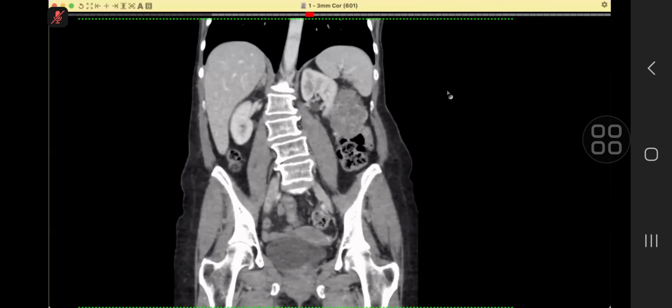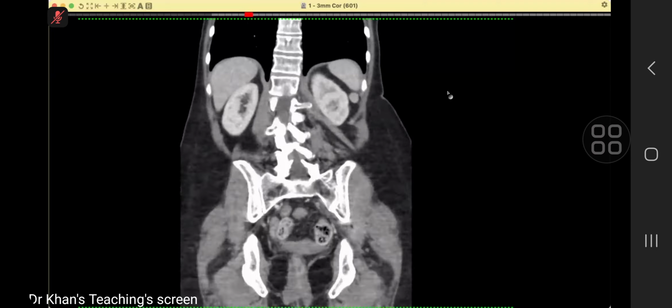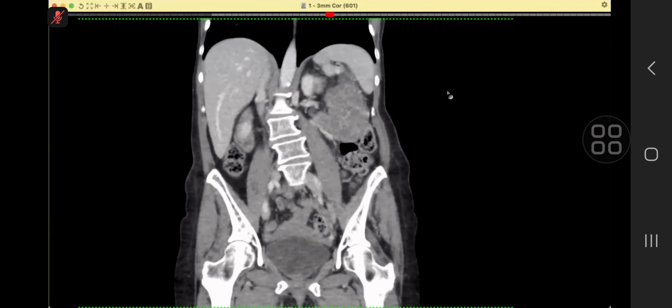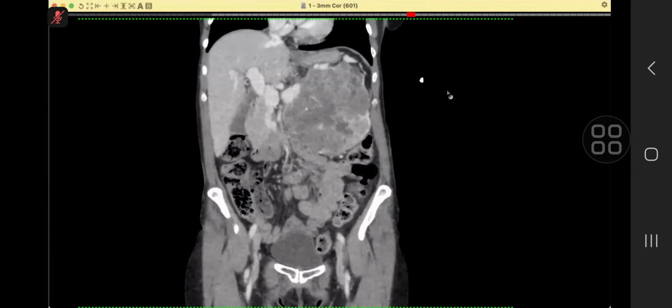What about the adrenals? It is not from the adrenal, not from the kidney. The retroperitoneal space is normally visualized. Spleen. So, okay, can you conclude? Give me your diagnosis. Sir, my differentials are that it can be. If you want to see the axial again, I can show you, but I just want you to conclude.